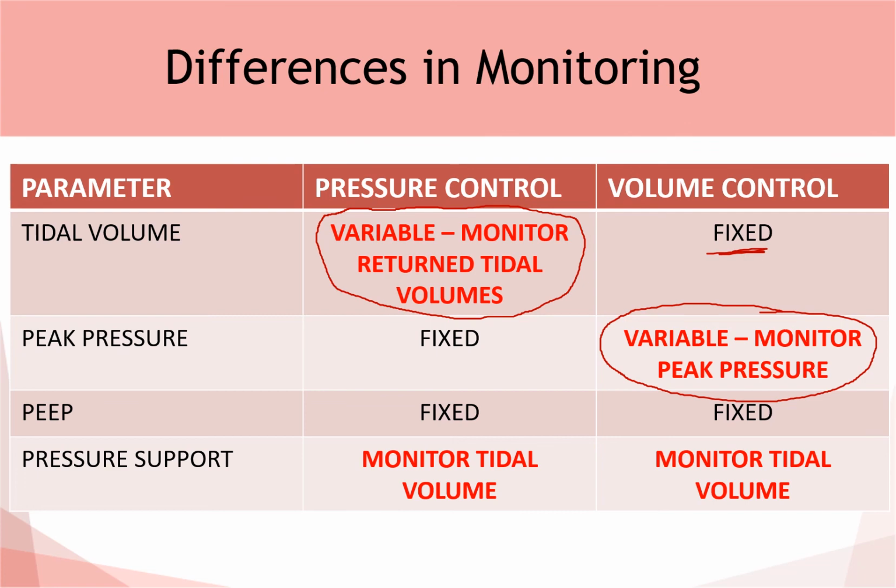It's important to note the PEEP again is fixed, and the same thing with the pressure support as before. You still have to monitor tidal volumes, and so this becomes important on a volume control mode: for the actual mandatory breaths that are assigned in the mode, it's important to measure the peak pressure, but for the breaths that are pressure supported breaths, it's important to note the tidal volume on those breaths.